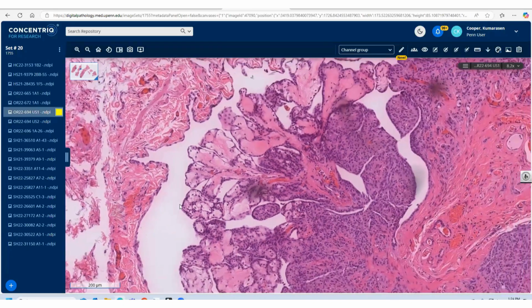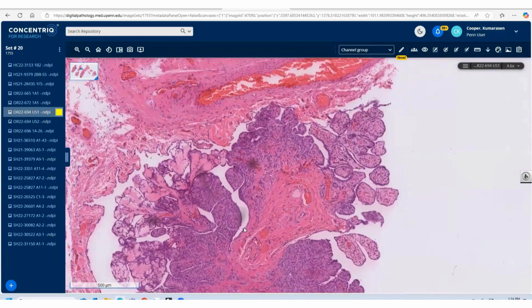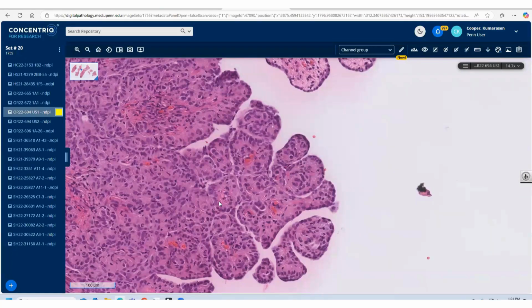I think there was some discussion or change in terminology of not calling it a malignancy, rather just a neoplasm with this papillary architecture and not much pleomorphism. I'm not quite sure, was it well differentiated papillary? Yeah, that's correct. You were well taught, Carla.